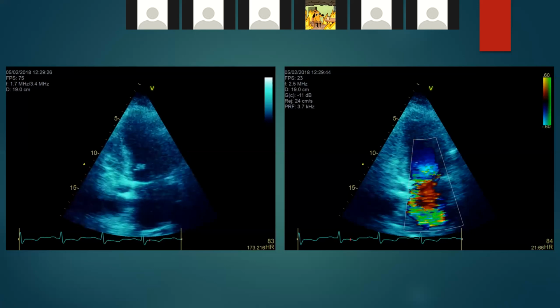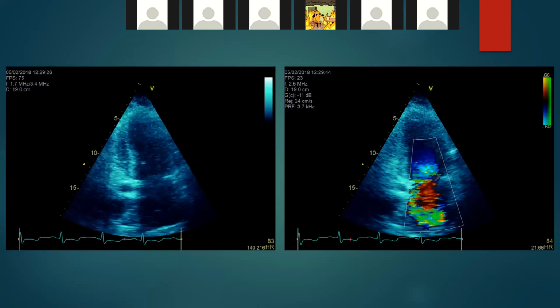And I would think that's probably consistent with the clinical history of knocking off one of her pap muscles from an inferior STEMI, non-STEMI. Any comment about regional wall in this 2-chamber?